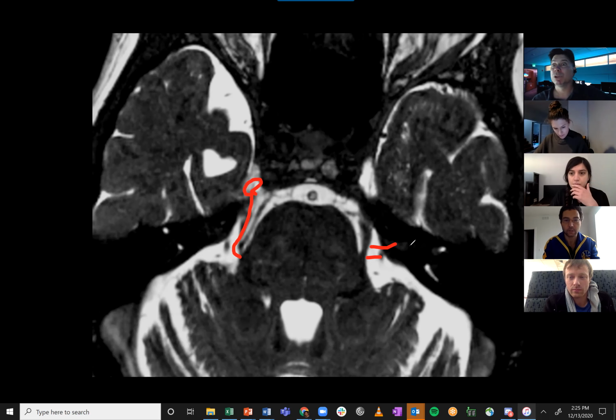Trigeminal neuralgia. So he may have facial pain on that side. This is a blood vessel that's pushing on 5 right at the root entry zone, and they often present with trigeminal neuralgia or trigeminal neuropathy. That's right. So he may have facial pain on that side. Good. Okay, next case.